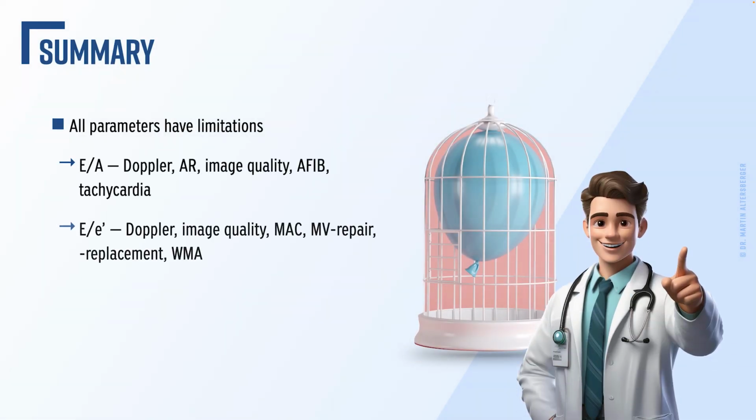To summarize this video, we have several parameters already at hand to define diastolic dysfunction and also to identify elevated filling pressures, but all those have limitations. E to A ratio: Doppler, AR, image quality, atrial fibrillation, you do not have an A wave. In tachycardia, you have this E to A fusion. We discussed this already, the E to E prime ratio, also it's a Doppler measurement. Image quality for all the measurements is essential. Mitral annular calcification could cause a problem. Operations on the mitral valve, replacement and repair, we do not really know the cutoff values, and also if you have wall motion abnormalities as well.